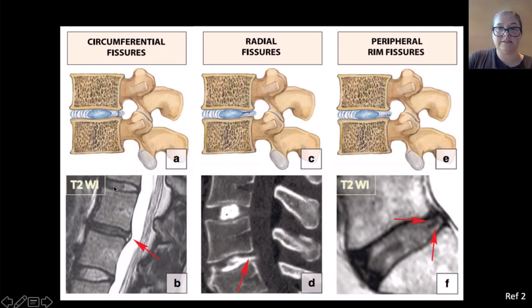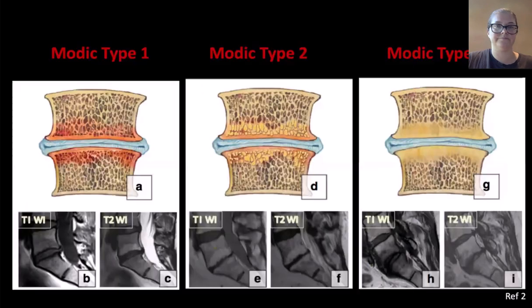Really, for us, T2 weighted signal hyperintensity in the disc, it's linear, it's curvilinear, annular fissure. Again, they can actually be symptomatic. They can occur acutely, but they can persist for weeks, months, years even, I have seen described. All right, so fissure rather than tear.